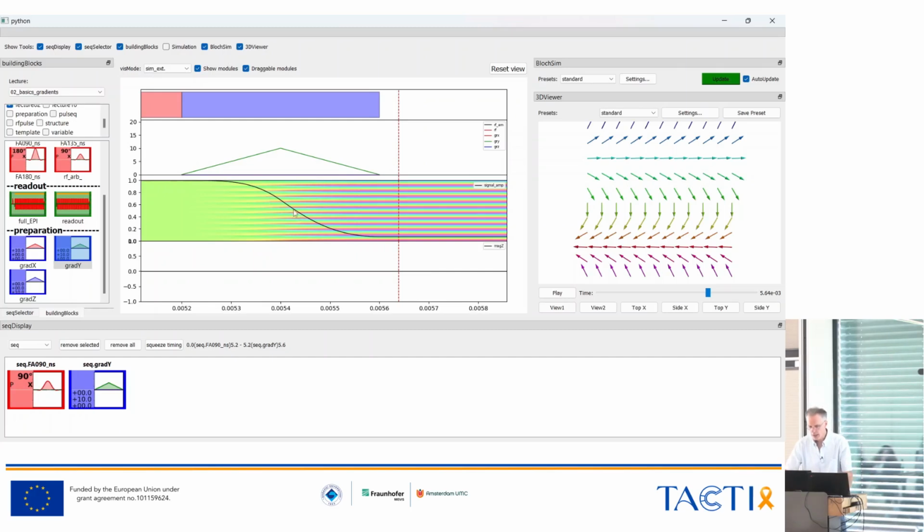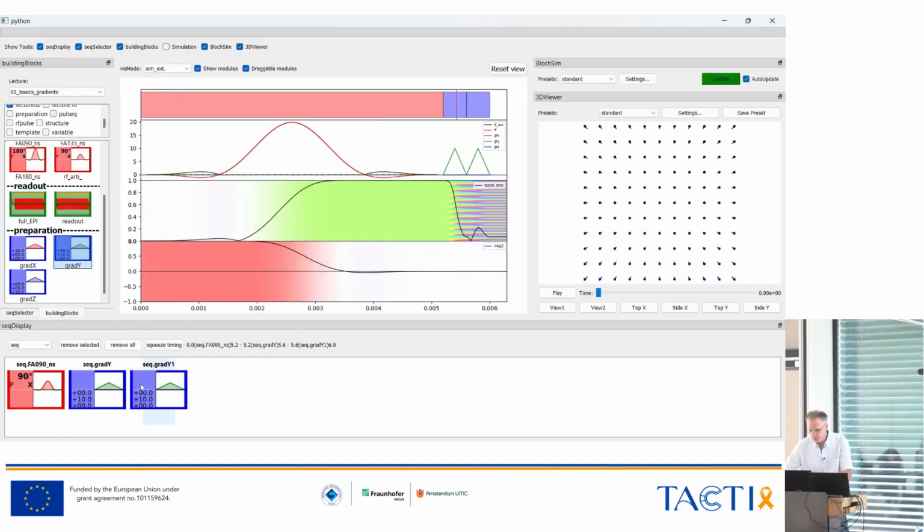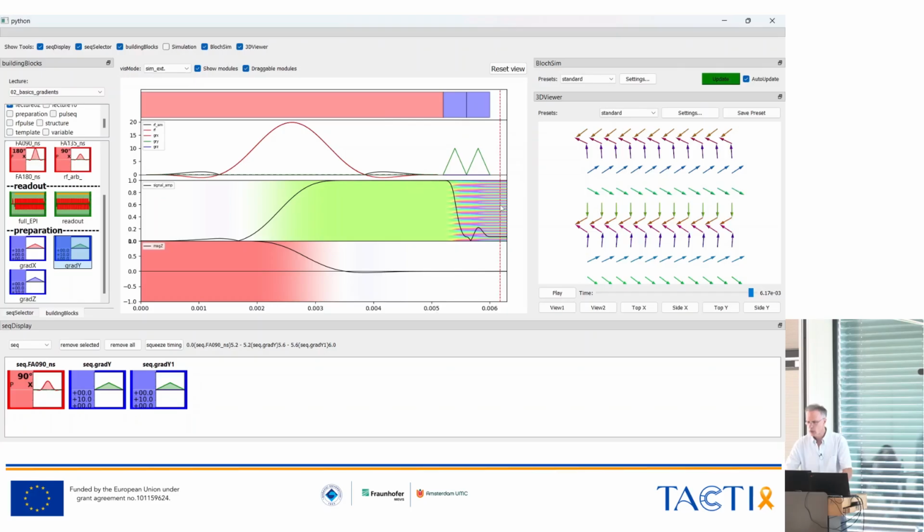If they are not as much dephased, like in this case, they still reduce the magnetization we can measure, or the signal we can measure. Yeah, the sum of all of those. But it's still positive, so there is still something we can measure. And we can actually, if you use exactly the same pulse in again, you could just double the effect. So that would mean by clicking here, the magnetization will just get even further dephased.